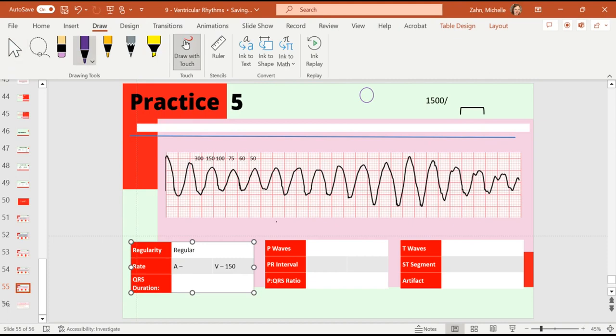What is my QRS duration? It's really hard for me to differentiate the QRS from the T waves here. I think on this waveform it's quite difficult. I would say this is the start of one and the end of one right here, and I would probably call this little rounded part the T wave personally, but it's very hard to differentiate. Any way that you try to differentiate, you're going to come up with a wide QRS duration. It looks like mine came out to about 0.20, the one that I measured, but it's wide. That is the takeaway.